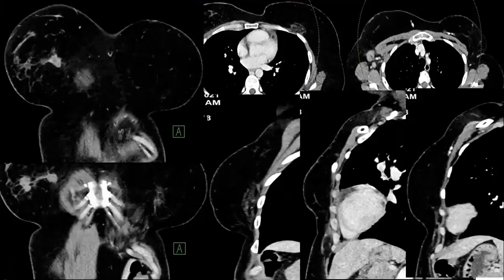Okay, we finish that. Look here, the breast is fatty. Look for this area. This is what? This which muscle? Which one? Abdominal rectus. Yeah, rectus abdominis. This is the right rectus abdominis muscle. Where is the left one? Where is the left rectus abdominis?